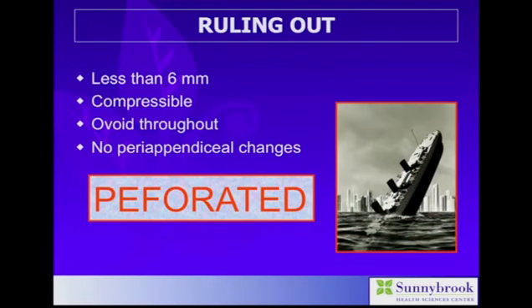The pitfall to this, although a relatively rare situation, is when the perforated appendix completely deflates and can measure less than 6 millimeters. However, the marked periappendiceal changes in these cases should avoid confusion.